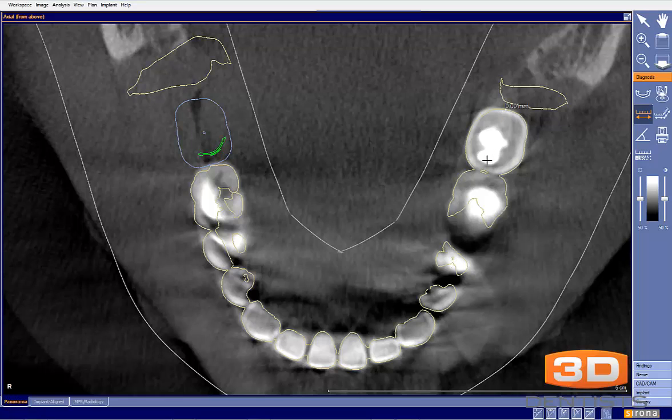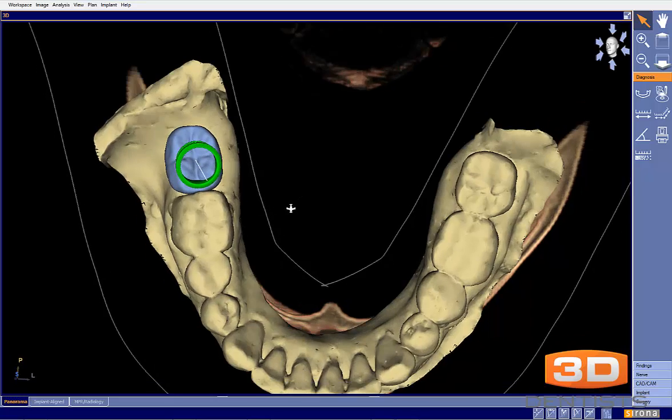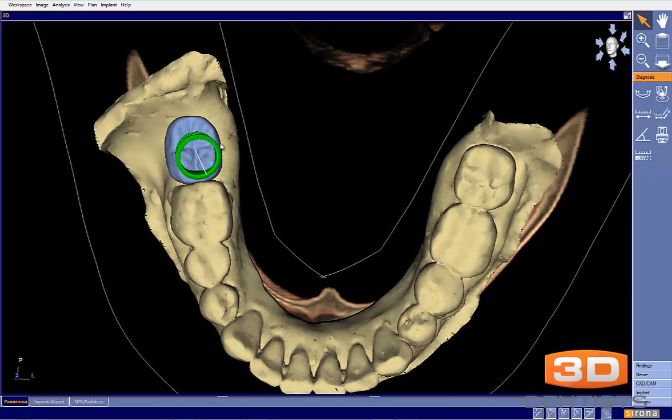and we measure tooth number 18, we're at 10.53, and if we measure our designed tooth number 31, we can see we're about a millimeter longer. A little bit less, but roughly a millimeter longer. So yeah, again, nitpicking things, but when we have all the data there, certainly on the CEREC side, let's make an attempt to design our ideal size crown, because again, that will affect positioning. We just want everything to be ideal. We can definitely see how, in looking at this, the tooth is about that much too long right there. So that would be one thing.